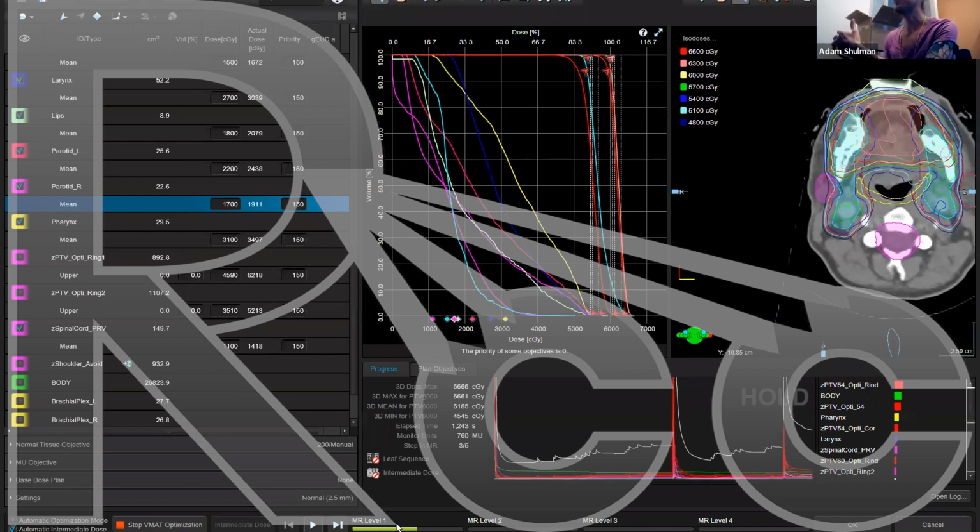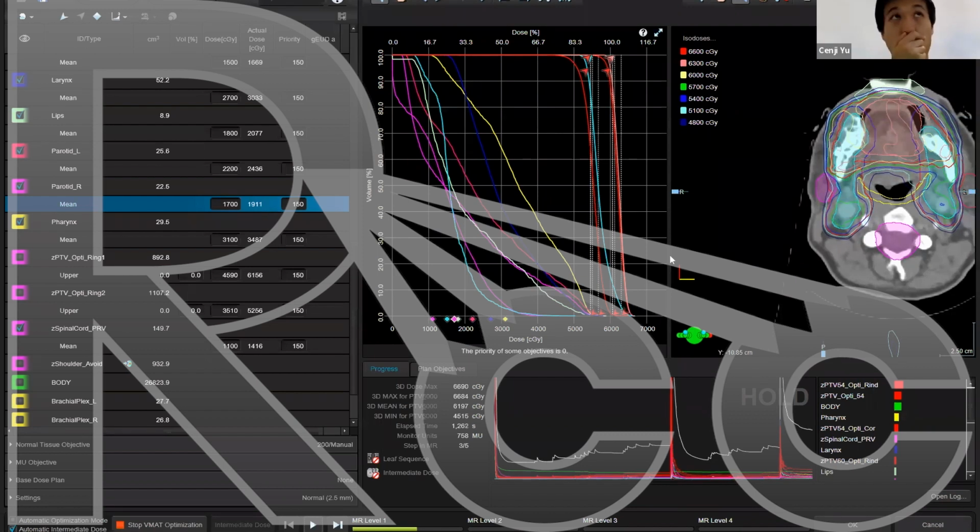Then it doubles the gantry angles again and optimizes those. So again, you're starting with these rough, big, coarse MLC motions, and as you go further, you start fine-tuning the MLC motions. That's the general idea without getting into too much detail about these different levels within Eclipse. But the same concepts apply to all planning systems.